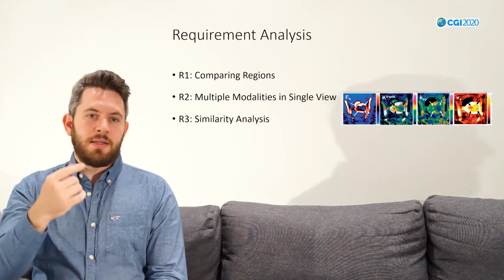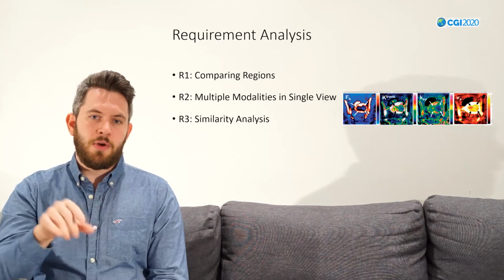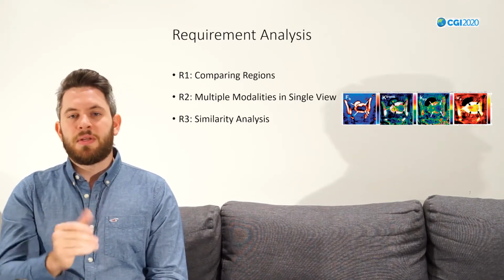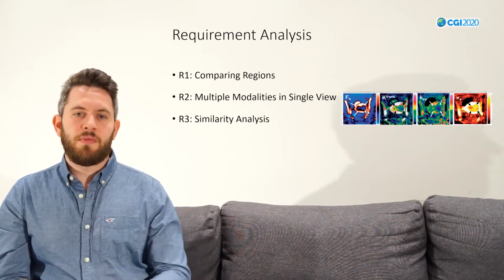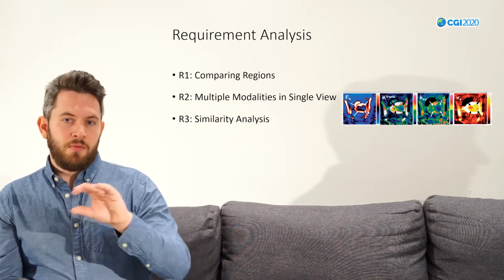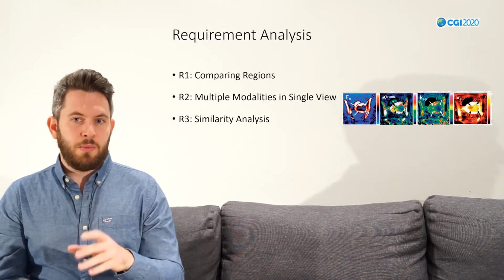So there's this idea that metastases which are in the same volume as the tumor maybe have similar properties, and these metastases could show up when we analyze similarity. Similarity could also be used to visualize the tumor or to segment the tumor.